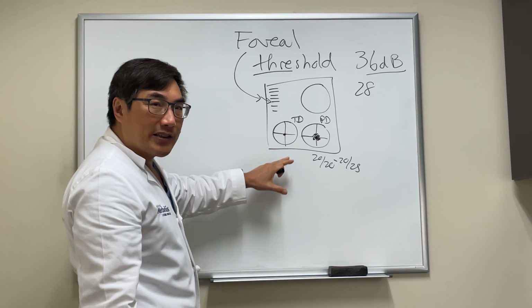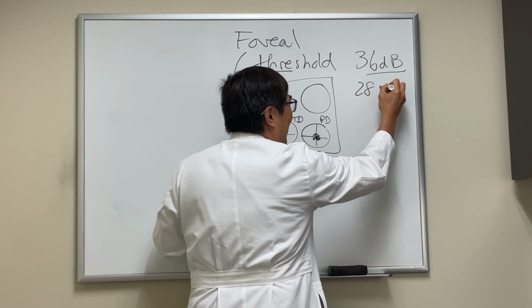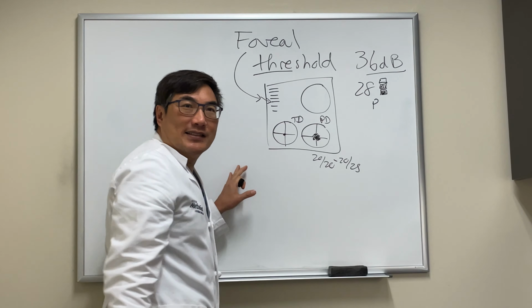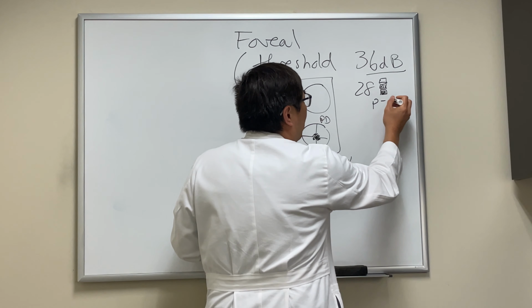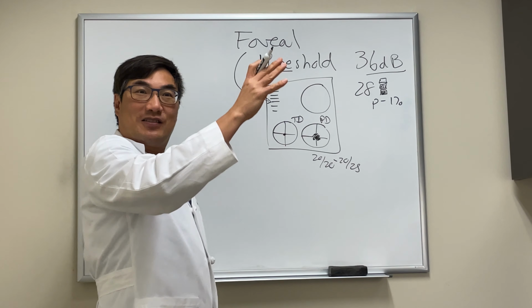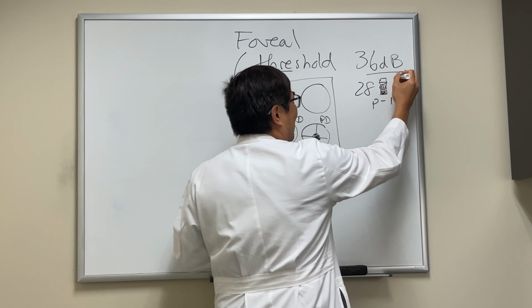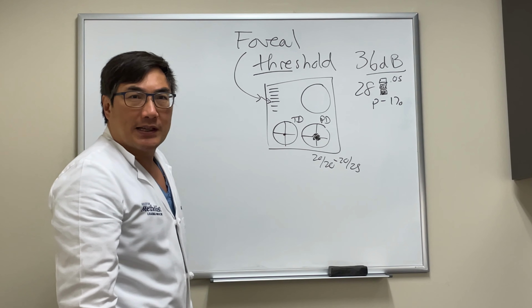And just like the other points, it's got this little black square next to it, and the darker that square is, the higher the significance, which means that you're a 1%er or a 0.1%er or whatever threshold we're willing to accept. The cut point for all tests, as you know, is 0.05, which is the 95th percentile for being normal.